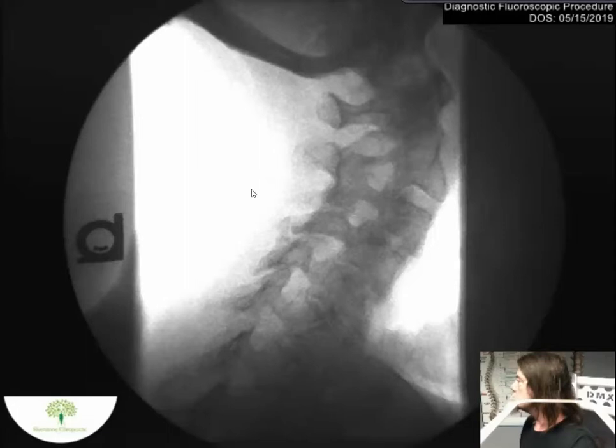What caught our eye is right on the back here. So this is actually a fracture here. You can see that white space there. This should be connected. It's a fracture in the posterior facet joint in this patient's spine. It's likely the reason why he's been having pain for so long. So I'm going to erase that.